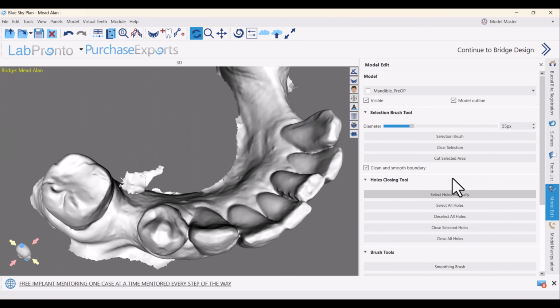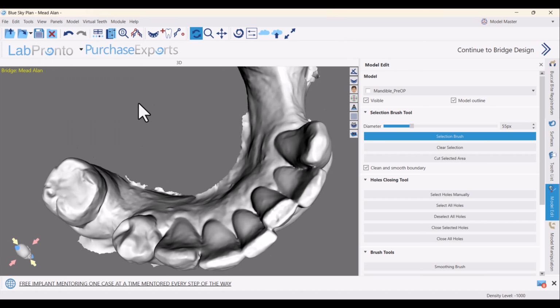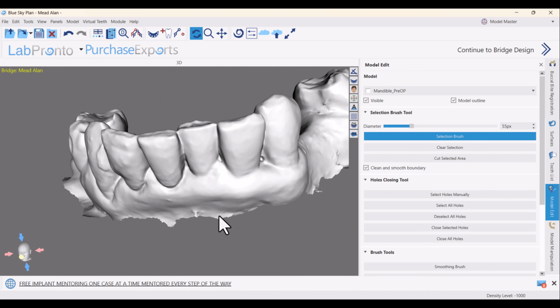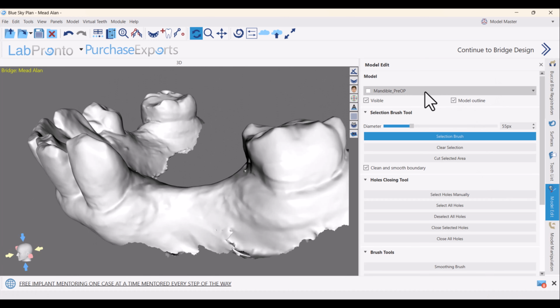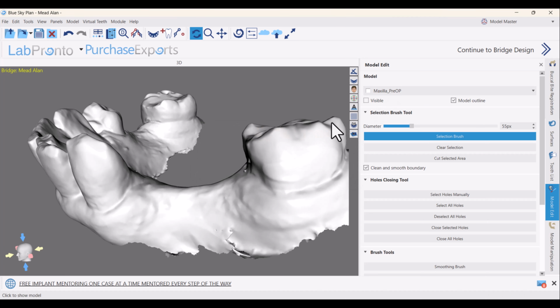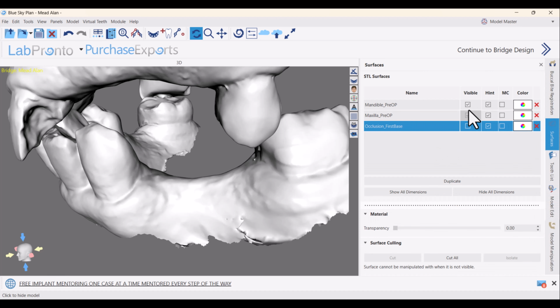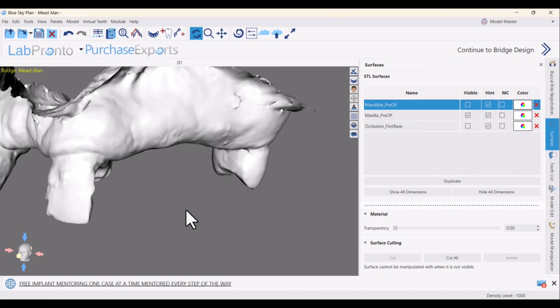Now you can't see these panels right here. On the right side, they're all on the panel thing right here. Good. I'm going to roll that. Now let's go to the top model here. Let's hide the bottom model real quick. Let's see here. Good.